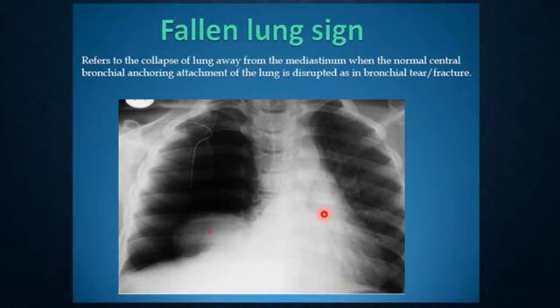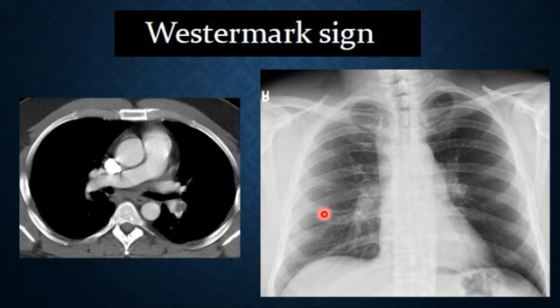Now, another sign is the Westermark sign. What does it indicate?